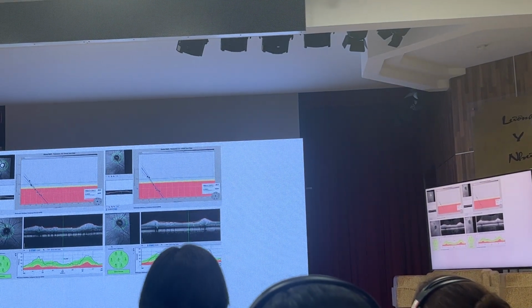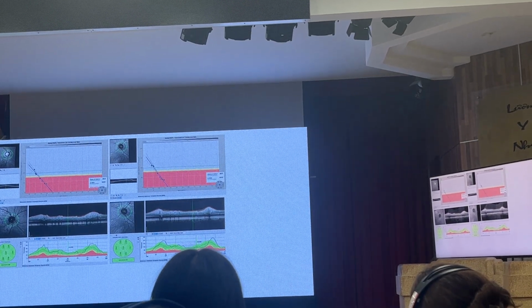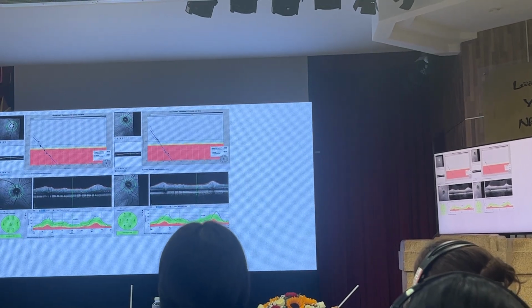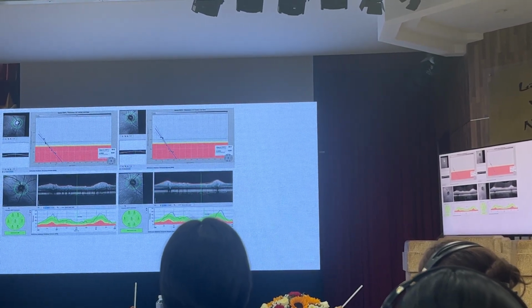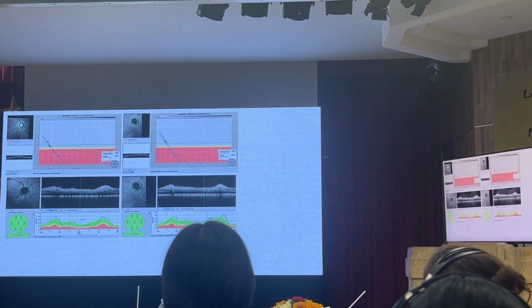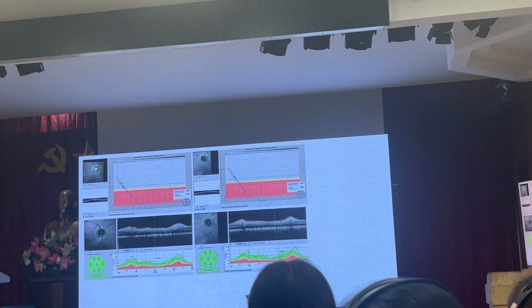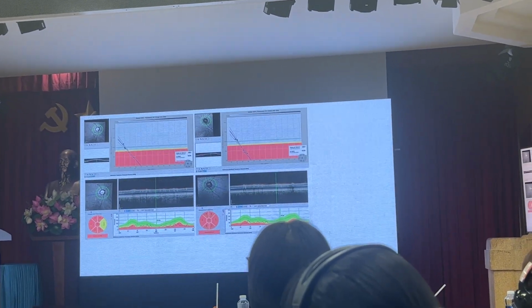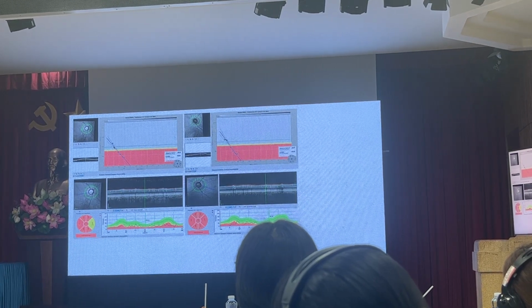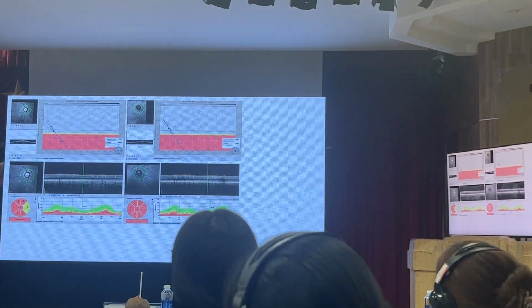And when we look over the course of the disease at the retinal nerve fiber layer, initially we have hypernormal values due to the swelling. And then when the atrophy comes, you get a rapid atrophy in comparison to the normative database into the red, and the nerve fiber layer went down. So this was the appearance in the beginning, swollen nerve fiber layer, and after the course of some months, nerve fiber layer gone. And this is the reason why the vision goes down also, and there's not much we can do at the moment in these patients.